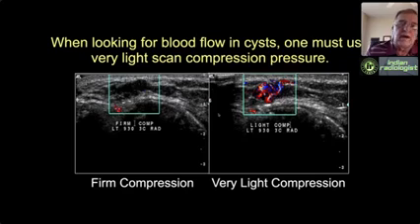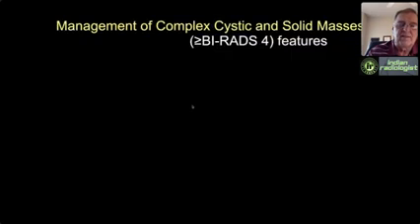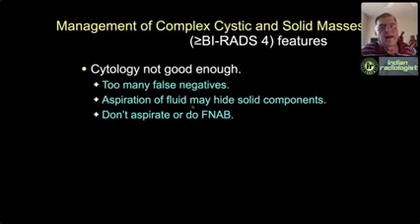So if you're going to use Doppler and you want to minimize false negatives, you have to use a very light scan technique, and I think the literature is somewhat unfair in that it hasn't emphasized this enough. Now, once you decide that this is a complex cystic and solid mass and that you feel that it's suspicious for a papilloma or carcinoma, I don't think cyst aspiration and cytology is the right thing to do. In fact, I'll tell you for sure it's not the right thing to do.